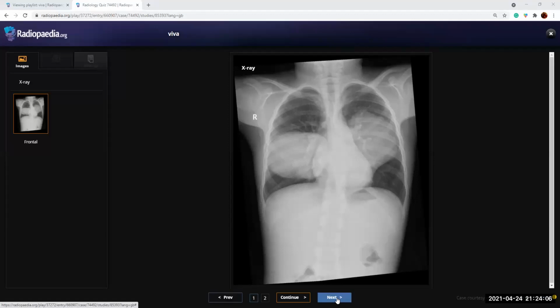I look at the clinical history, and also imaging wise. Imaging wise, I look at the CT scan to see on X-ray. There will be air in the cyst, a complication of air. I'll compare the previous images, and if there is a new onset air in the lesion, it can be suggestive of any communication with the bronchial tree.